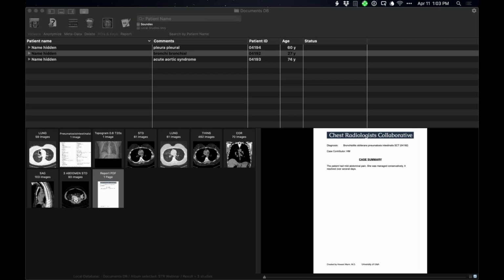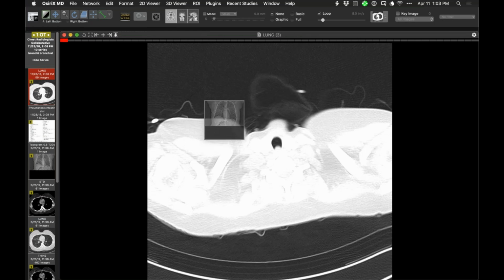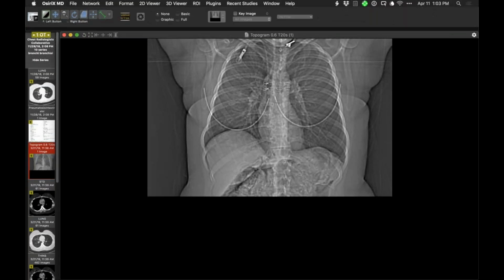Okay, I'll start with this patient. I actually want to put up the scout image. Sometimes I forget to look at the scout topogram. For many reasons, it's good to remember to look at it. This case being one example, but sometimes one sees pathology in the area that is not subsequently imaged on the CT. So it's, for many reasons, a really good idea. So here is a rather dramatic finding on the scout topogram.